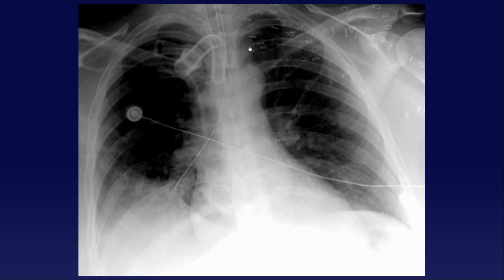Yeah, so what happened here is that portable technique isn't very good. People tend to have low lung volumes, you have a lot of basilar atelectasis, and also in patients with a larger body habitus, you tend to have more soft tissues down here than up here. So to be able to window this part better or this part better might compromise another area. Do you see what I'm saying? One window doesn't fit all needs. Okay, yeah, that makes sense.